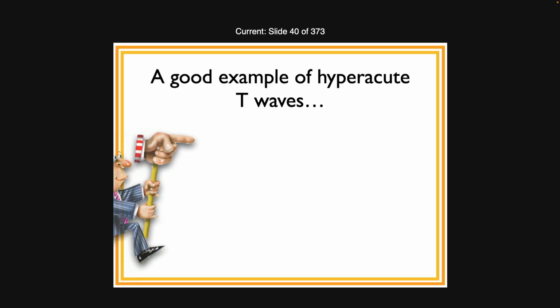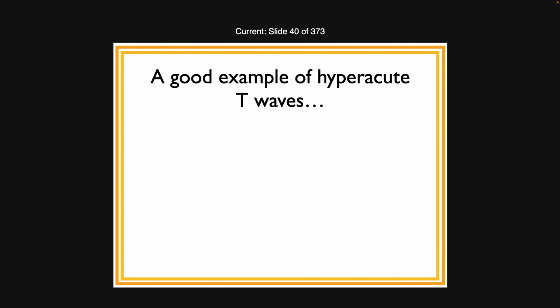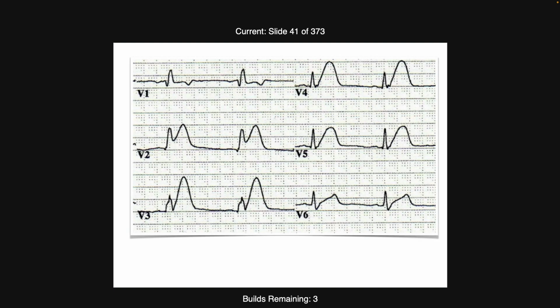Okay. Now we've looked at the next 12 lead before, but we're going to look at it now with our new definition. So I showed this one before when we were talking about the 6 millimeter, 10 millimeter definition. And what we said, just looking at the V leads, is there's one lead with ST elevation, so we don't quite have cath lab criteria, but we have all these enormous T waves.